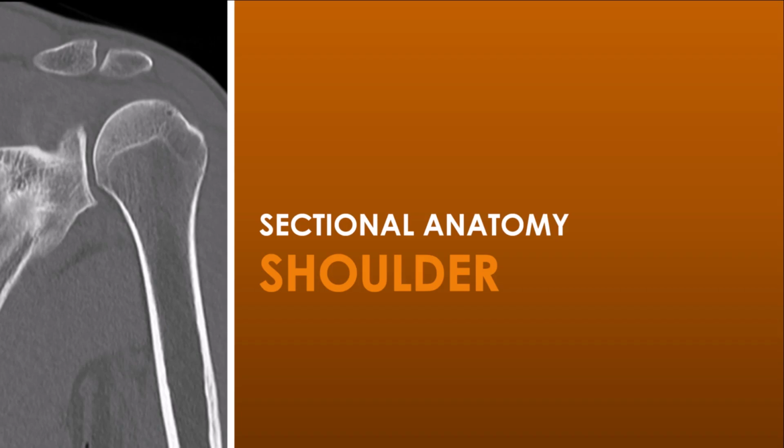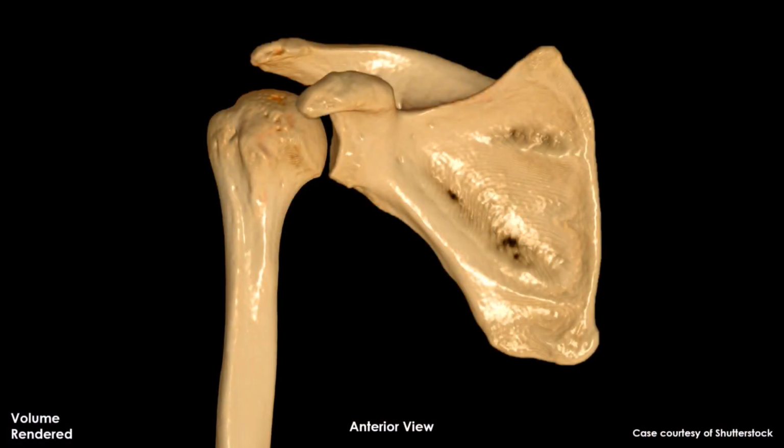Hey everybody, welcome back. This lesson is about the shoulder as seen in CT imaging. We'll start with a volume rendered image. This is a volume rendered CT image of the shoulder.